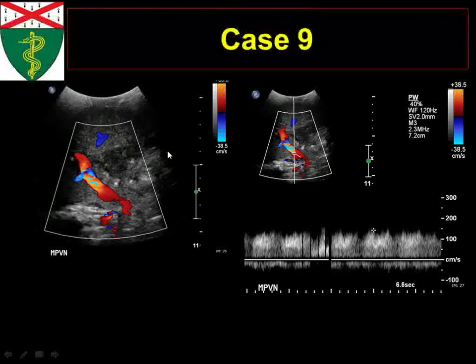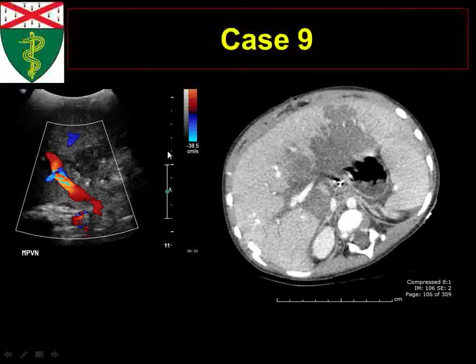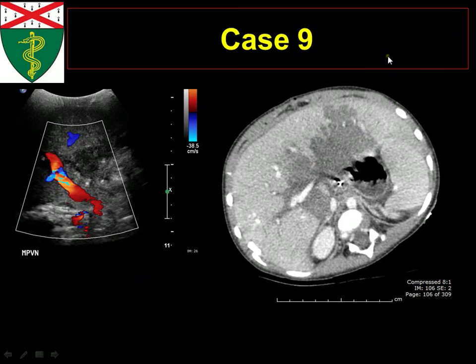So very good. This is a pediatric patient actually, and this is what his liver looked like. What do you think these things are? Areas of low attenuation, non-enhancement. Is that just further from the thrombus? It's just not being perfused? It's just not being perfused, exactly.